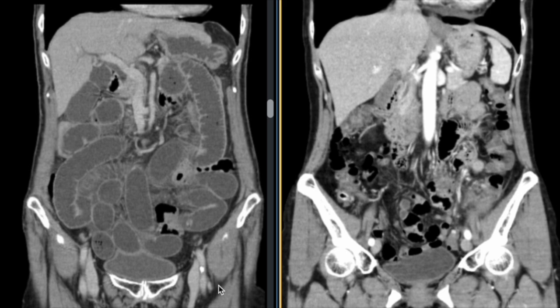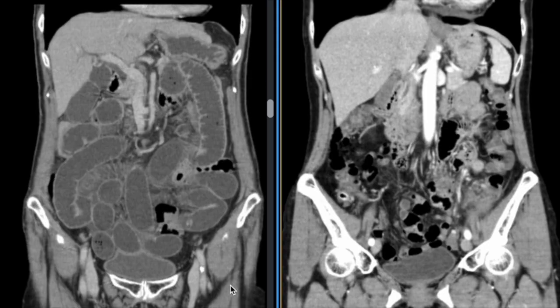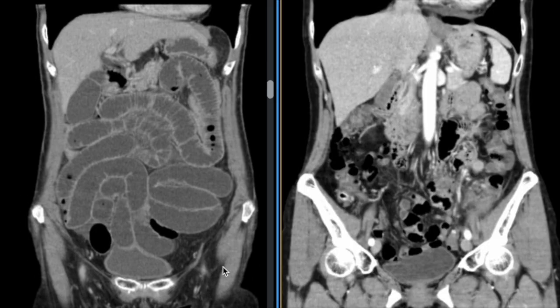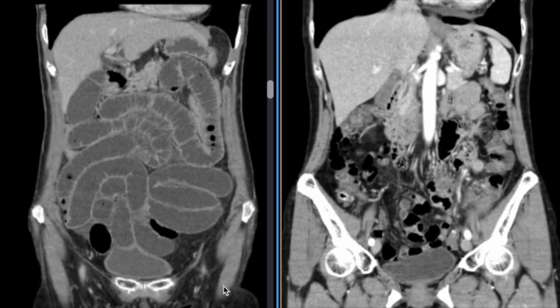On the other hand, the small intestine in ileus is distended everywhere. Because it is obstructed somewhere, digestive fluid and gas accumulate inside, causing it to balloon outward. The intestine is weak and not moving much, which is why you can see signs like a niveau that indicate lack of movement. So, after identifying the ileus, what should we look for next?